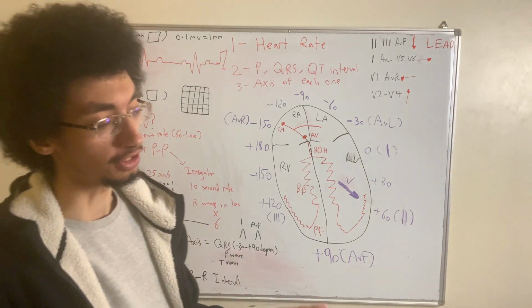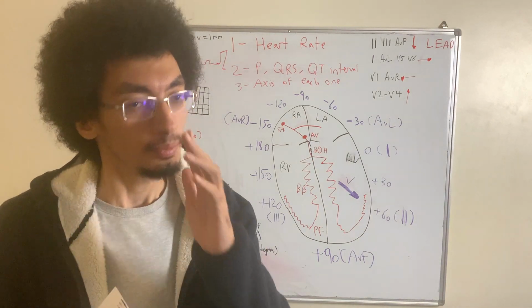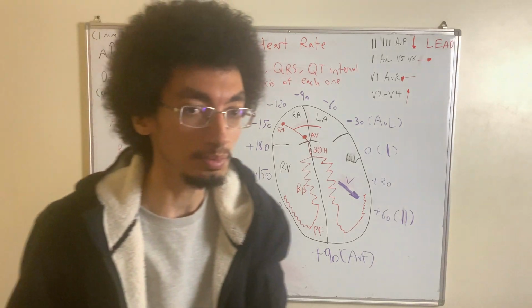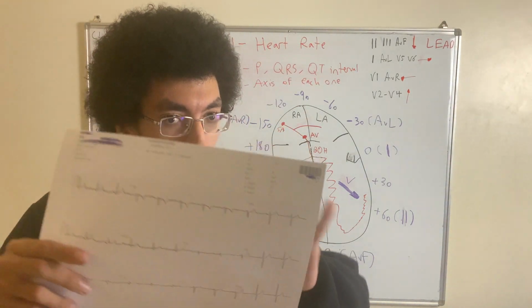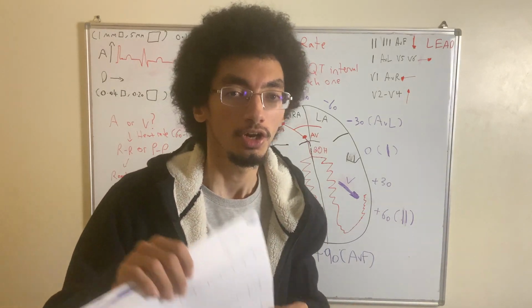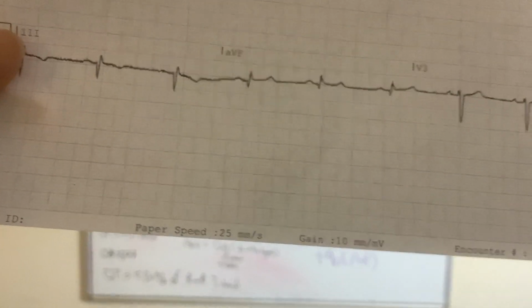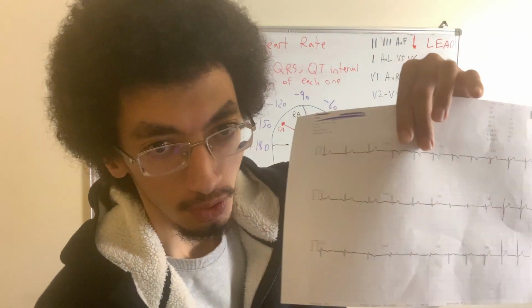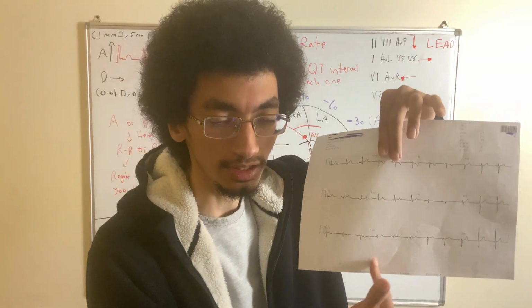You will find it especially if you have an EKG paper that's printed from a machine at 25 millimeters per second. That's the standard; most EKGs will produce the tracing at 25 millimeters per second. You can find it at the very bottom, where you can see 25 millimeters per second. This suggests that the lead at the very bottom, commonly lead 2, will show you the entire reading from the right side towards the left side at a 10-second duration.